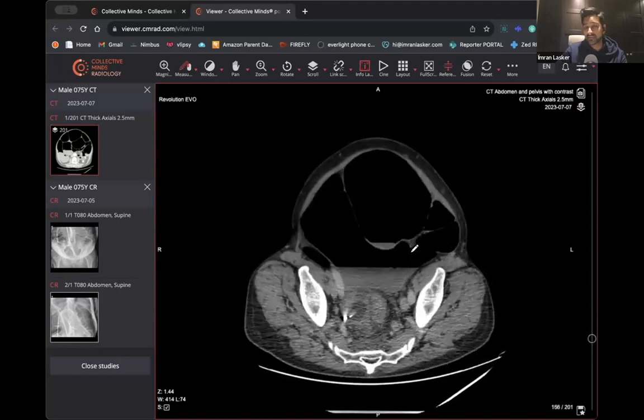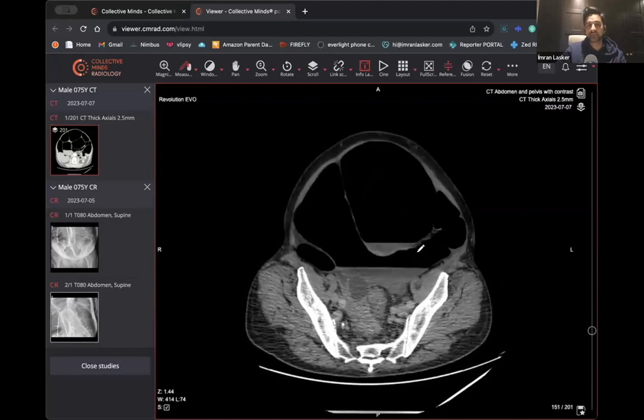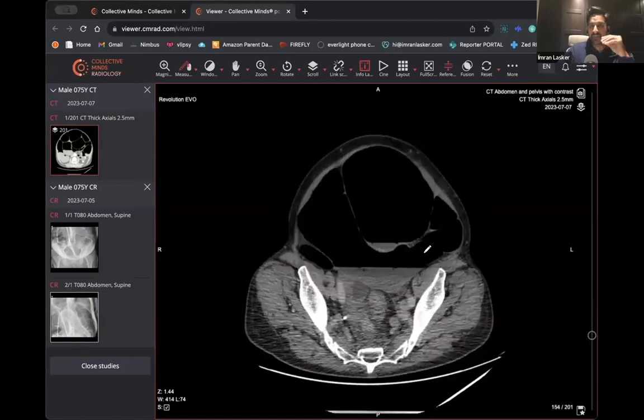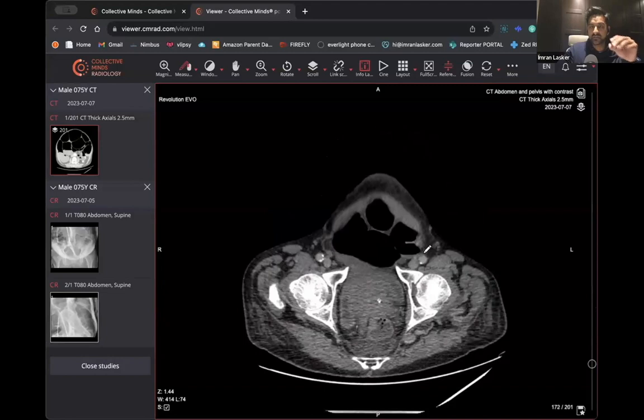So don't fall for that. And in truth, I have fallen for that, where I've gone for the hernial orifices thinking it's an obstruction, but actually the obstruction is far further proximal to where I thought it was. So it's very important that you really look at the hernias. If you've got a hernia, make sure that there's definitely bowel going in and out, and there's definitely dilatation going into the hernia in the first place.